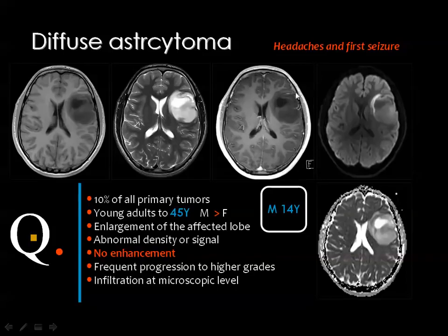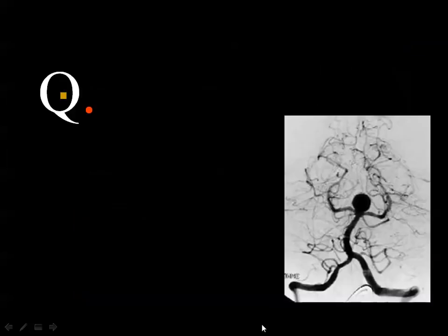It may be the vessels on the surface of the brain, and then the diffusion restriction is very mild, which is accepted for the gliomas as well. Then diffuse astrocytoma occurs at a relatively younger age, and it does not show contrast enhancement, sometimes mistaken for an infarction, but the infarction will produce diffusion restriction.